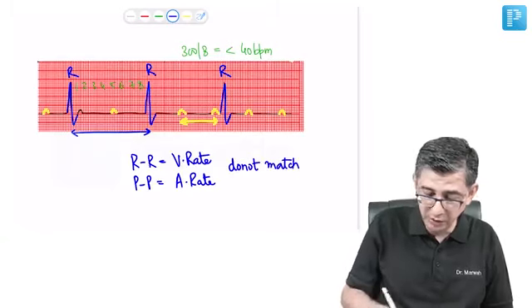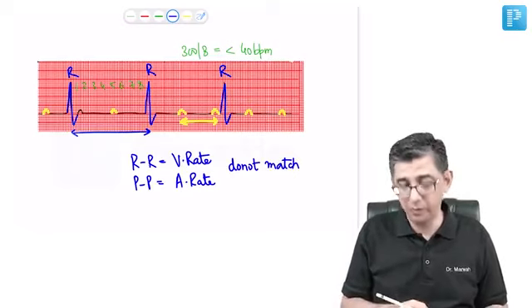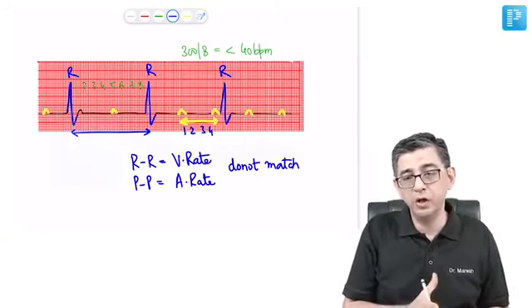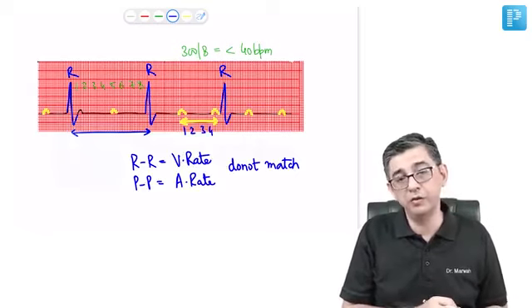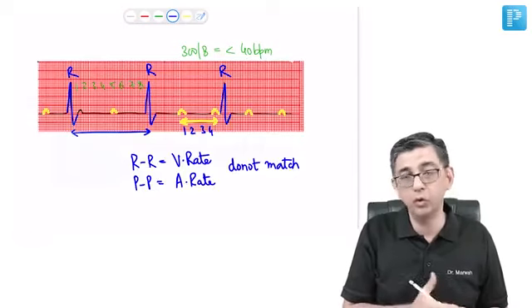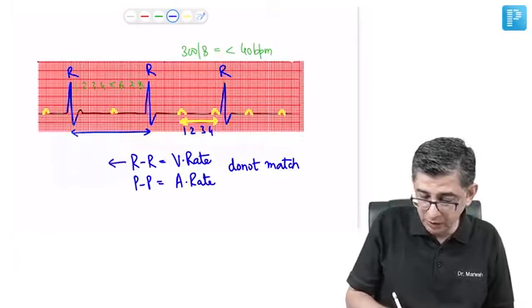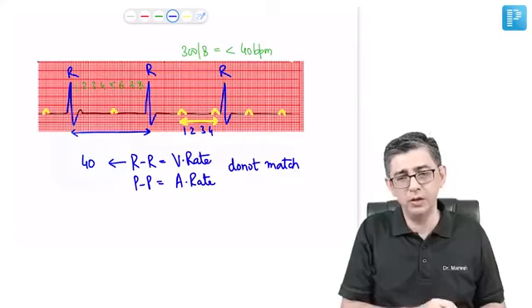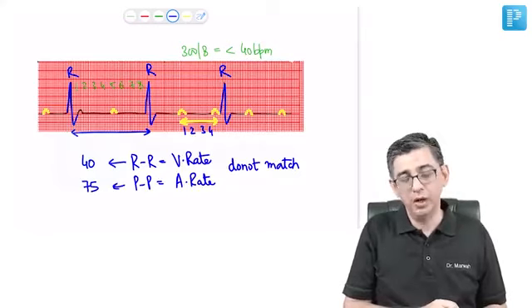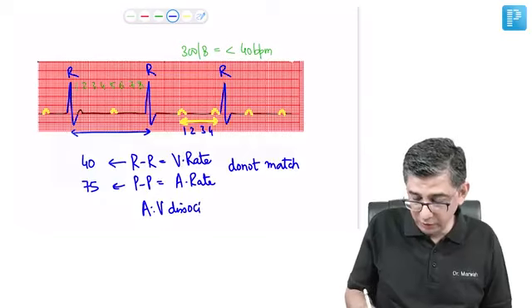That is one interpretation that we have seen. Like I would say the ventricular rate of this patient is 40 beats per minute. But if I count the number of squares here, 1, 2, 3, maximum, let me say extrapolate to 4, it would still be a PP interval. That would be 300 by 4, which would be still 75. So the atrial rate is 75, ventricular rate is hardly 40. The two are not matching. I'll just put the mathematical values also so that you can do some calculation here. Ventricular rate 40, and the atrial rate of the patient is coming to be approximately 75. So the atrial and the ventricular rate is not matching. I am going to use a term here, AV dissociation.